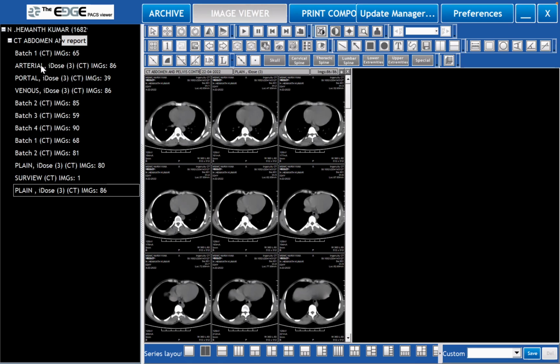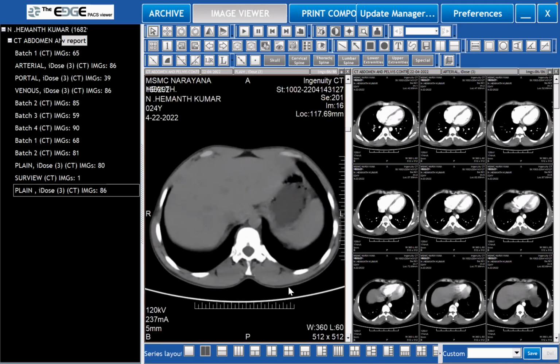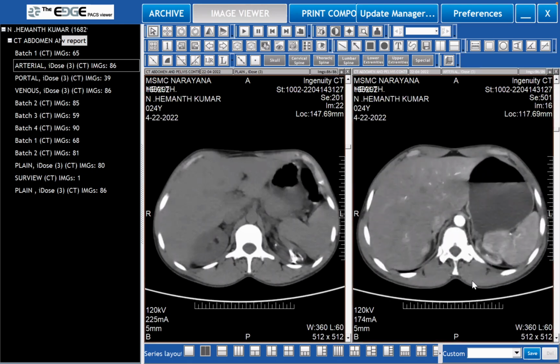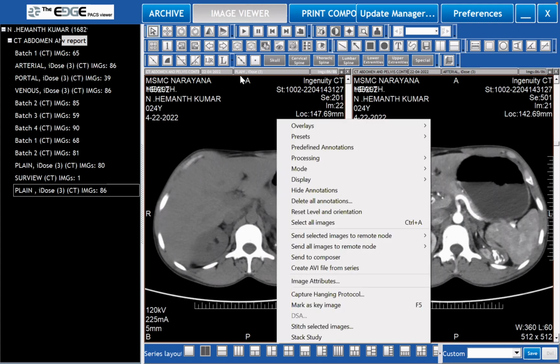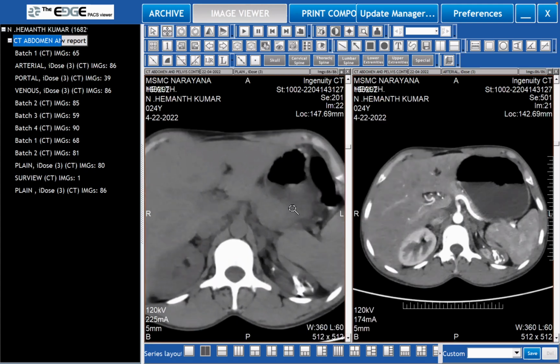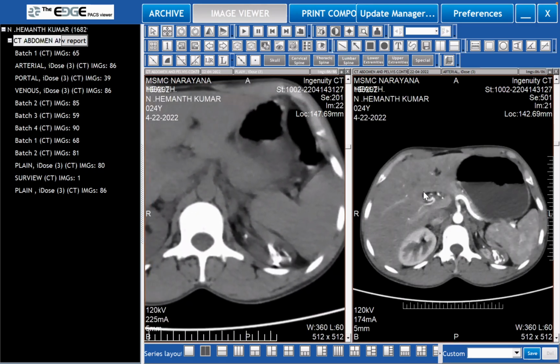Well, look at it this way. If that radio density has increased in the plane, has increased in the contrast film, then we are suggesting that there is function in that area, isn't it? Yes, sir. Fine. They indicate that there is function in that. Okay. But look at the state of this kidney and look at the rest of the kidney.